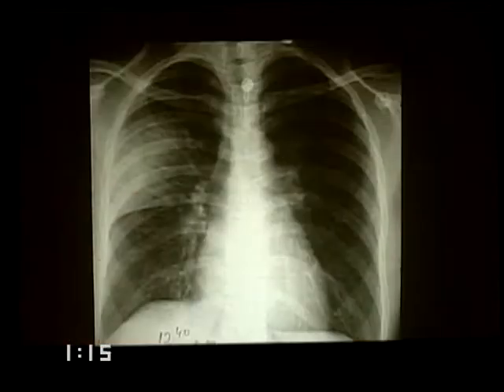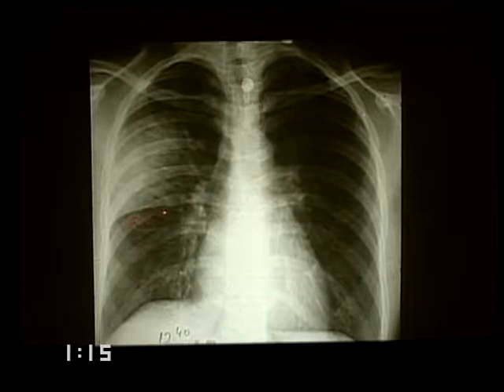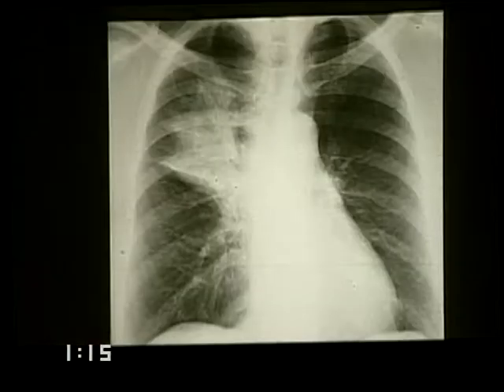Two classic examples of airspace disease. The alveoli are flooded, more or less homogeneously. As one extends centrally, it becomes less and less opaque. That is, the fluid is leaking from these alveoli into these more centrally. It is only sharply marginated where it abuts a fissure or the periphery of the lung. Another very similar and almost undifferentiatable from this one is only different in the sense that the fissure is displaced cranially, and if one looks closely, the fissure is slightly bowed.